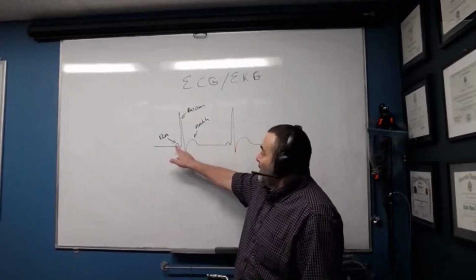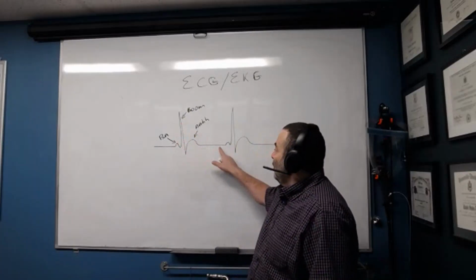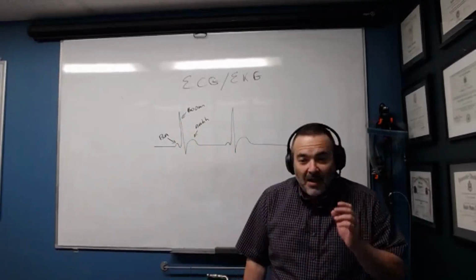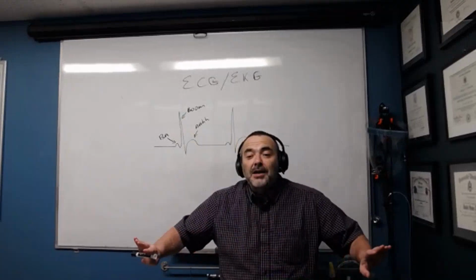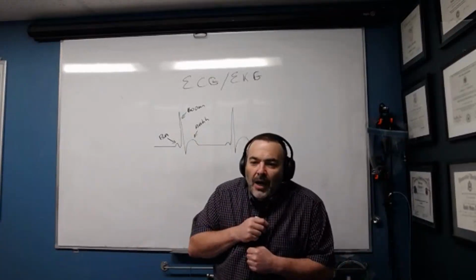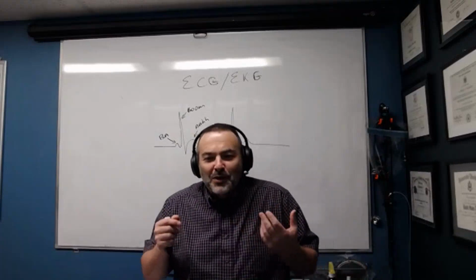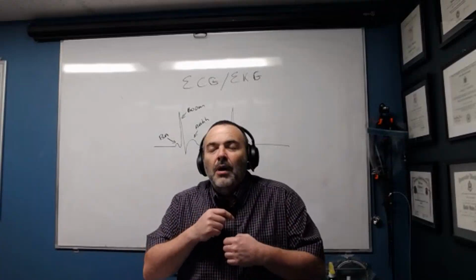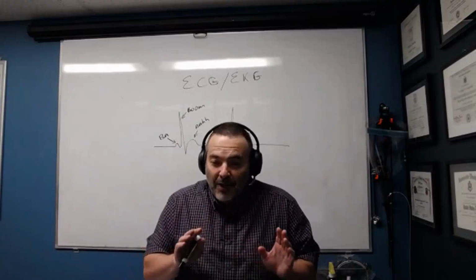And you can see it over here. Small ba and a big boom, and then the ah, and then a little break until it begins to beat again. So it's ba boom, ah, break. And then again, ba boom, ah, break. And all of a sudden, you begin to understand how things work in the heart. Ba boom, ah, break. And again, ba boom, ah, break.